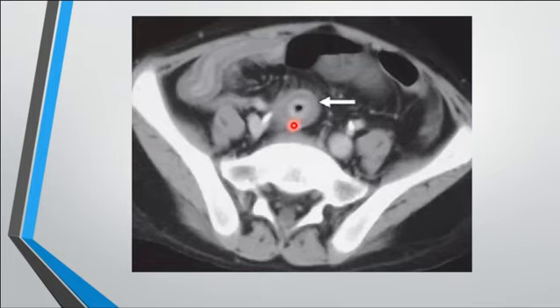Well, here there is a hypodense center surrounded by three layers: hypodense, hyperdense, hypodense. Exactly. And what are these layers? The central hypodense is the lumen, the hyperdense is the mucosa, and the last, a little bit hypodense, is the muscularis. Exactly. So there is stratification of the small bowel, there are layers, okay?